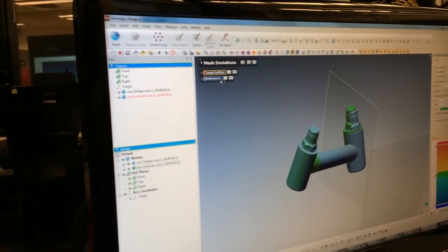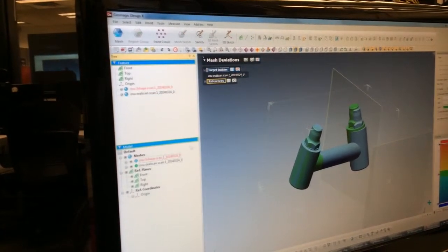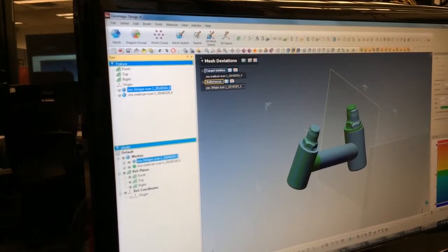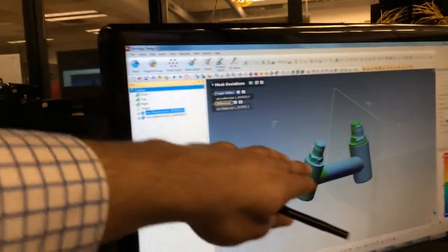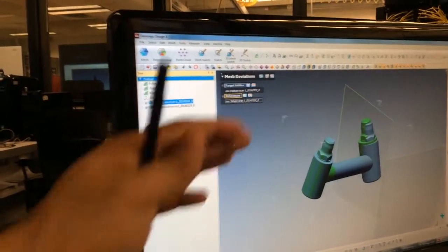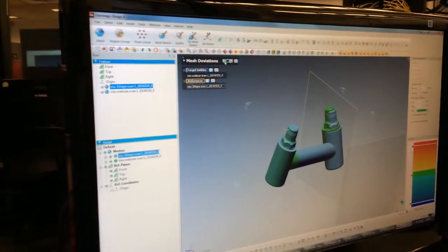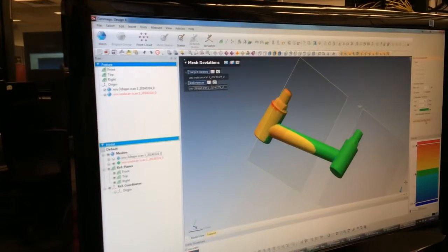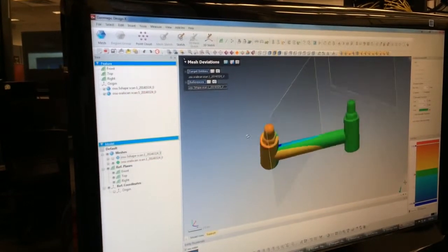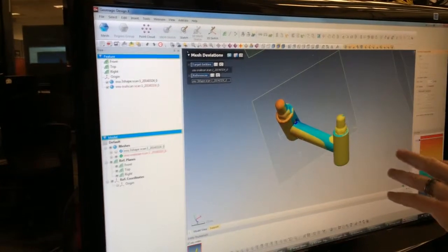And again, you're picking a target, you're picking a reference. It's kind of the same interface. I also wanted to ask what tolerances, how do you change that? How do you modify that? And then it gives you the data accordingly, right? Correct. So here you can see what it does, and these are all things you can turn off.